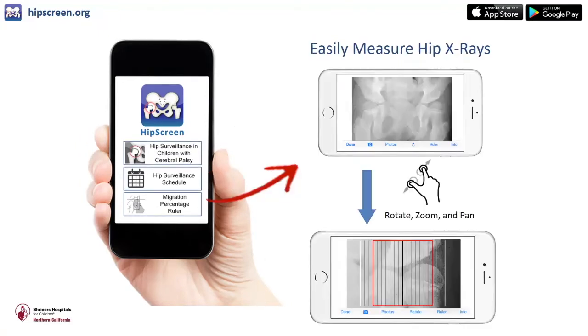Finally, the most novel aspect of the tool is the ability to take a picture of an x-ray, whether it be on a computer screen or even a piece of paper, and then easily measure the migration percentage on the device. Now, I should say the HipScreen app does not store any of the photos that you take within the app to your device, and it does not transmit any of the photos that are taken within the app to any third party or any other server.